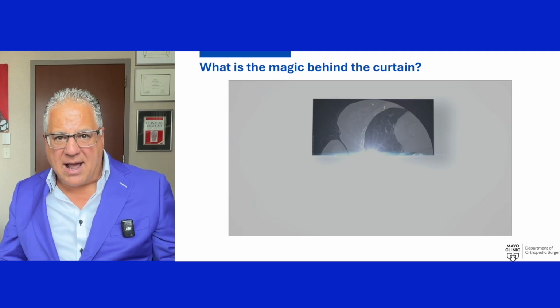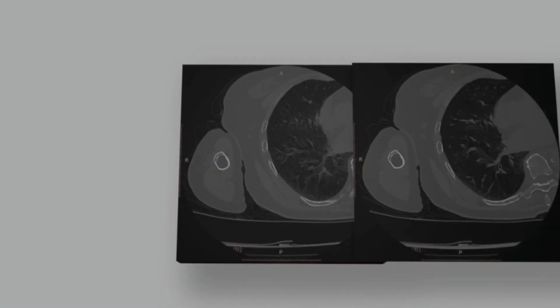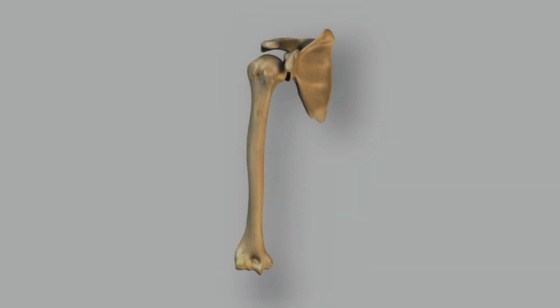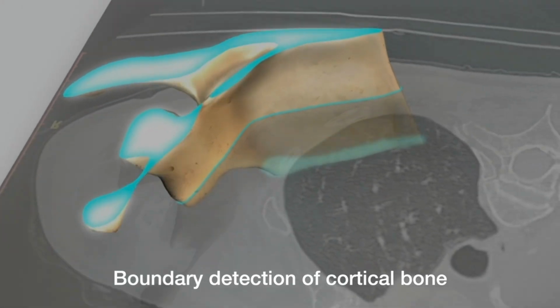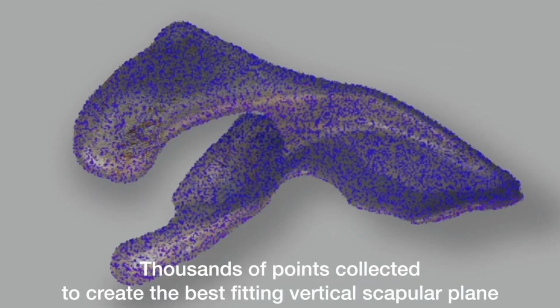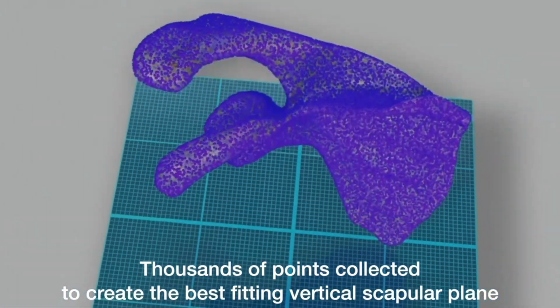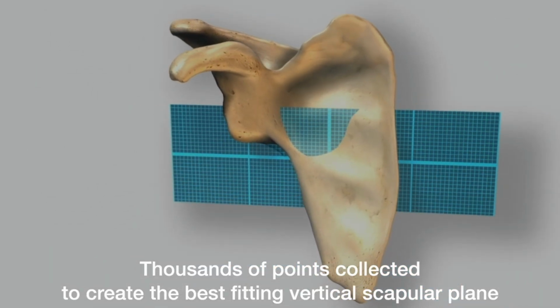So when you upload the CT scan of your patient into BluePrint, what's happening mathematically? What is the computation? What happens is that all these different slices of the DICOM files of the CT scan are analyzed automatically, first to understand what is the boundary of cortical bone, so that different slices can be stacked and create a three-dimensional representation of the scapula. Then BluePrint will throw a number of points, a cloud, that will allow it to compute what would be the plane that best fits the vertical aspect of the body of the scapula. And that will be your first reference point.